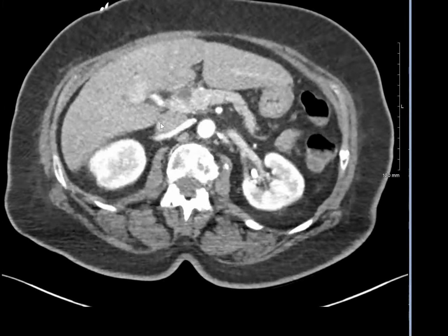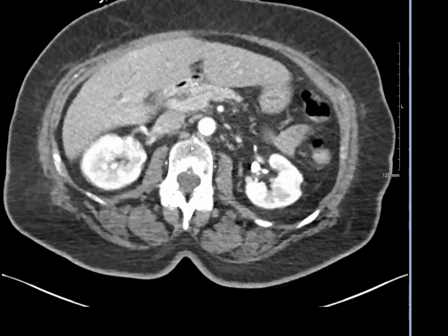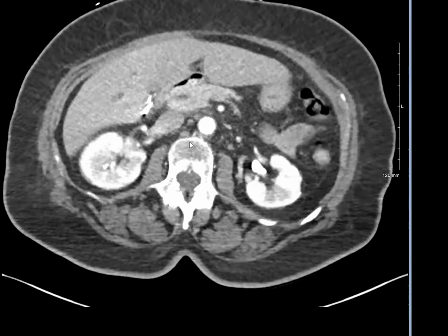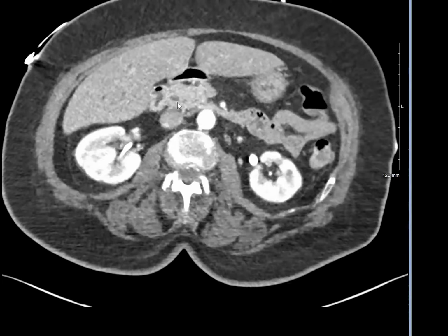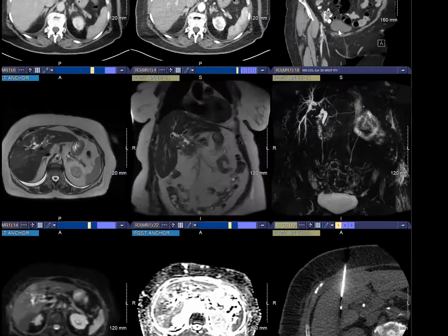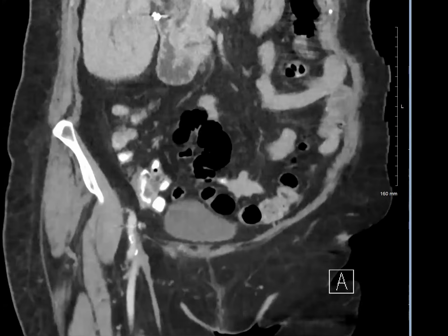So they settled her, I'll show you multiple other images subsequently. They settled her acute condition, gave her antibiotics, she came out of that. And sure enough, because of this biliary finding, they got an MRCP. But before moving on to the MRCP, let me quickly show you.